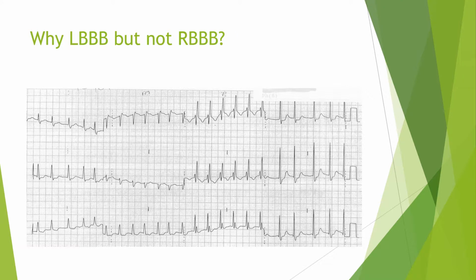So why you've always heard you can't see a STEMI in a left bundle, but you've never heard that when you're talking about a right bundle, has to do with this exact concept. In a right bundle, and here's an example, virtually everywhere on the ECG, the QRS complexes are upright or the T waves are concordant. They follow the QRS complex. And so you're not going to get ST elevation. Now you can get ST depression.